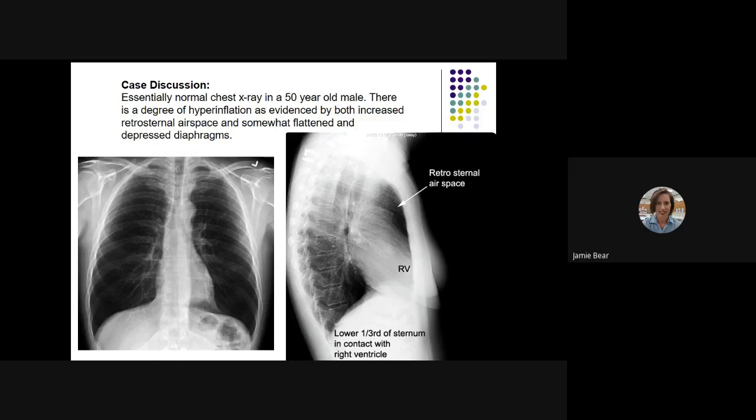So the opposite is true if you have atelectasis. So if you do have major atelectasis on the right side, it would pull the trachea towards the right side. So a trachea will be shifted away from extra air, and when there's not enough air in the lungs, it'll pull the trachea towards the affected side.